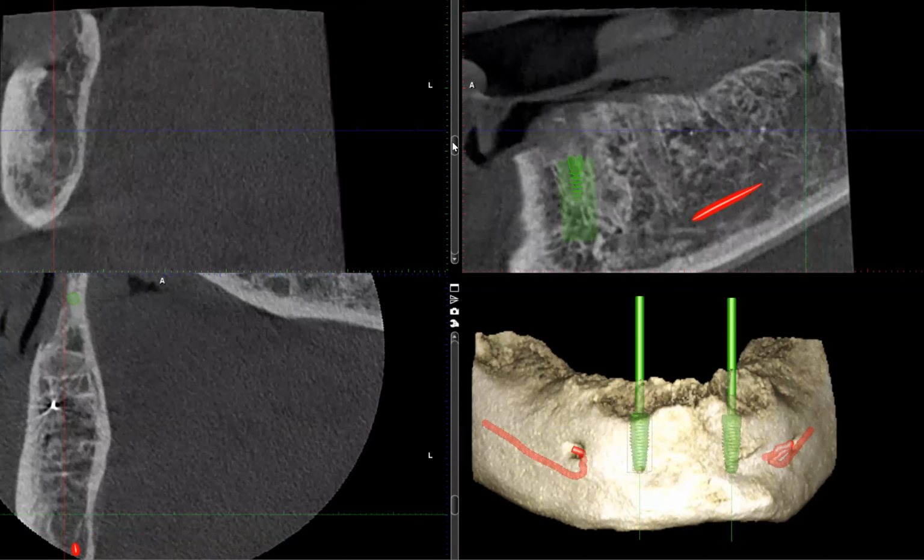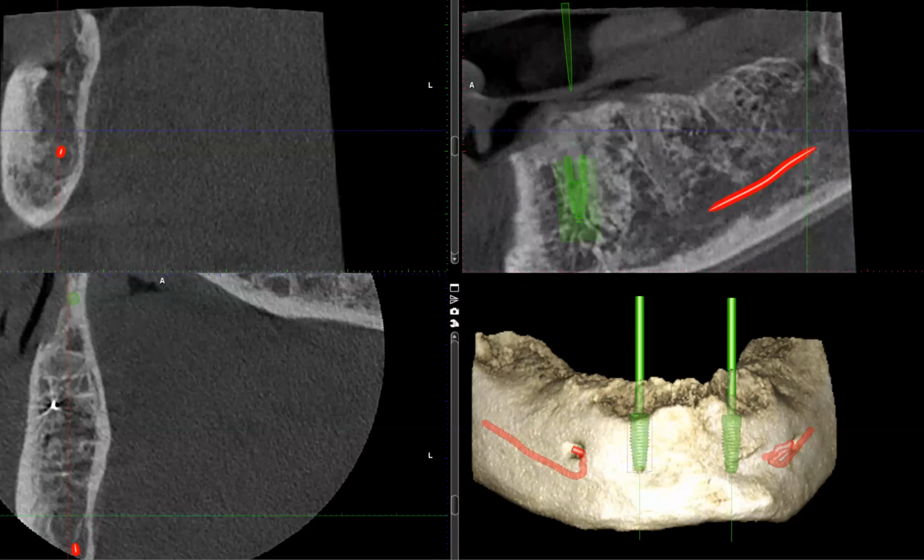And also, given the fact that this is located in the area of a missing, most likely, third molar, and the fact that I have seen extraction sites that never reach the normal trabecular bone density and appear very similar to this, I think this is an osteoporotic focal marrow defect.